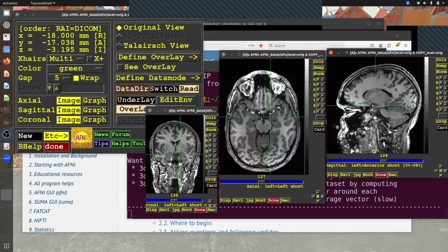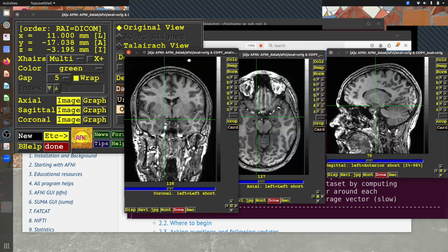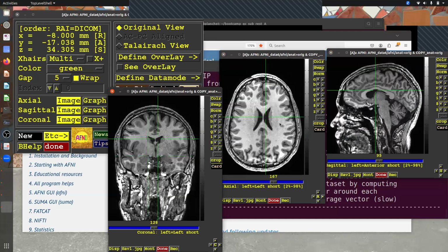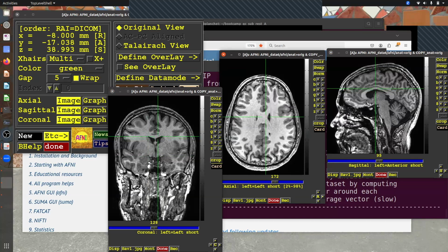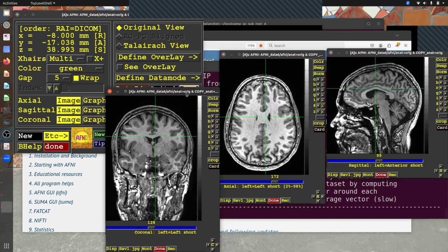And as you can see here, it has good anatomical information. You can see the different parts of the brain, the different tissue types. The white matter here is light and the gray matter all around. If we hop up to the ventricles, we'll see the ventricles are dark. This kind of data helps us recognize all the different parts of the brain, and that's fine. But this is not really the functional side of things because we don't see it doing anything over time. This is a static three-dimensional volume.